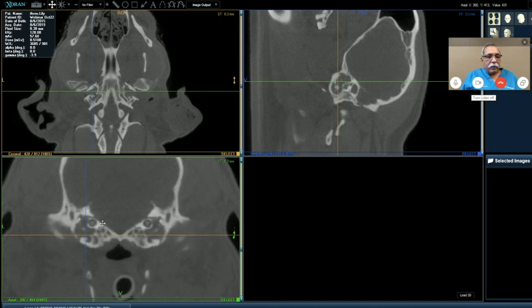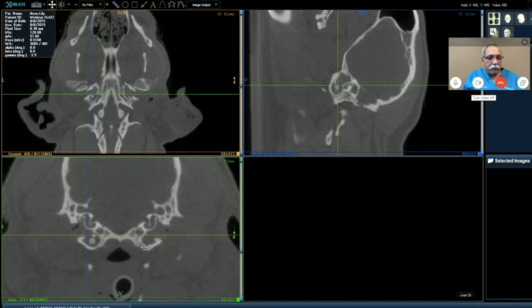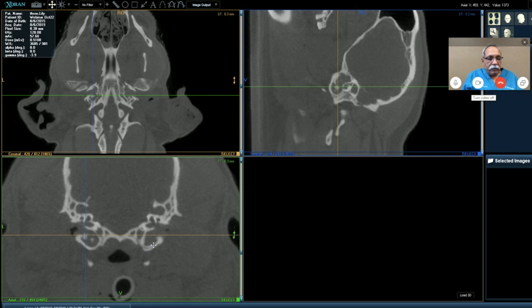Cholesteatoma, again, is growth of squamous epithelium from the ear canal skin and the tympanum going into the middle ear. The characteristic right here is that so much bone is destroyed. The interesting thing here is the cochlea is absolutely normal in this dog, which is going to have some effect somewhere. But the tegmen tympani, which is the bone between the middle ear and the brain, on the right side is pretty much impaired.